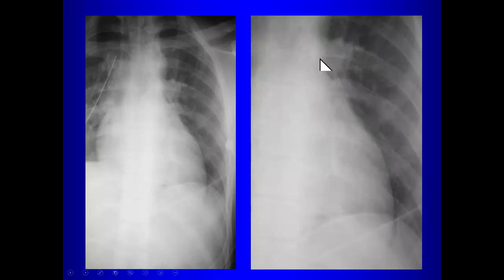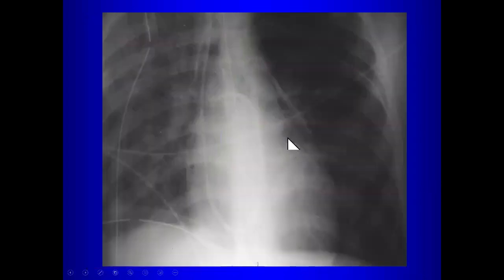Now, in this patient, there's air right alongside the heart border, but it stops before we get to the aortic knob. So where is this air? Yeah, so this is pneumopericardium. Usually this is iatrogenic after surgery, patients who've had drainage of pericardial effusions, or patients who get pericardial windows. They can have some air that gets into the pericardium. So here's the pericardium, here's some air in the pericardium. That's pneumopericardium. Usually this is after a procedure.